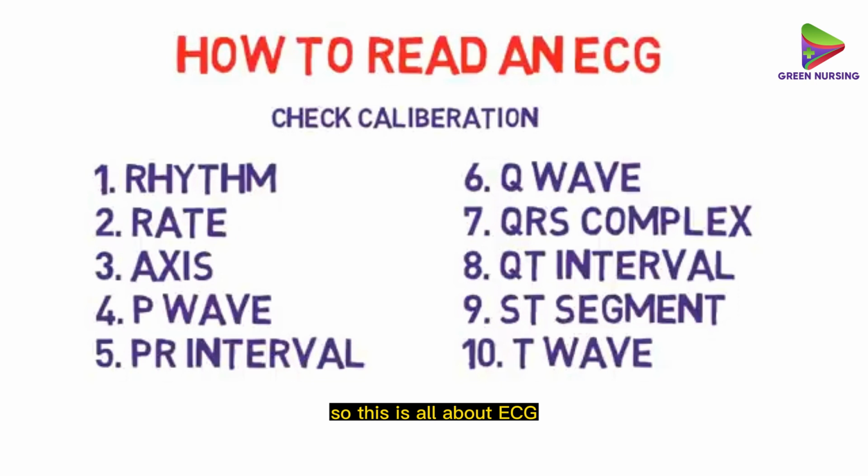So this is all about ECG. Always think of these 10 steps in this manner, and you will be able to detect the majority of arrhythmias very easily, guys.